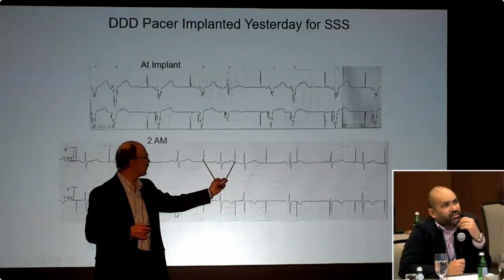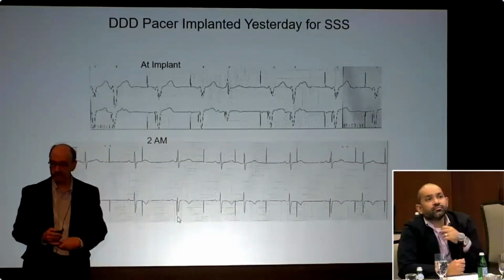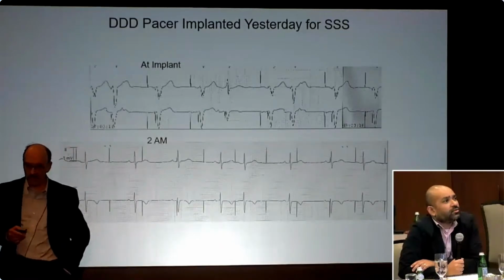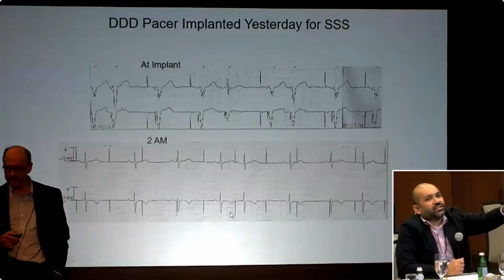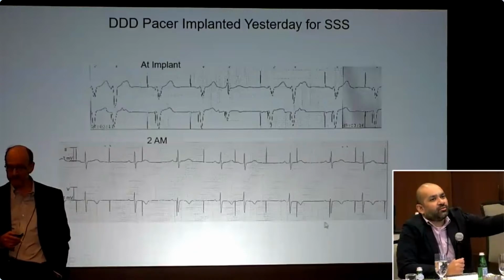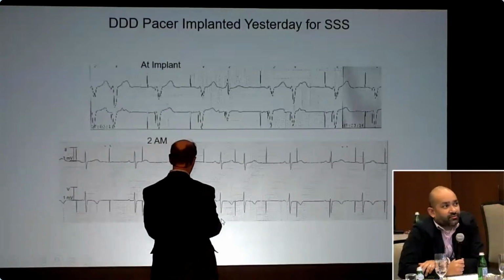What happens here? Can you show that portion again? Yep, keep on going. If you just measure spike to spike, is your spike to spike interval normal, Dr. Ellenbogen? That's fixed throughout the strip. You can measure it. Come up here and measure for yourself.